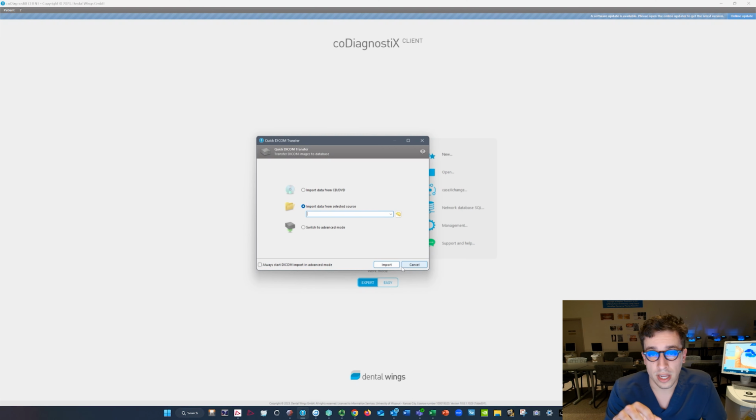From this screen right here, I'm going to go ahead and import just the denture scan that we have. So this is the CBCT of just the denture with the fiduciary markers on it, without it being in the patient's mouth. And you're importing this as a whole new patient. It's kind of convoluted and I don't know why it's this way, but that's just what we're going to do. Something important to note is that we are not providing this one to the AI assistant. We're going to align this manually. So go ahead and locate that and let's import that file.